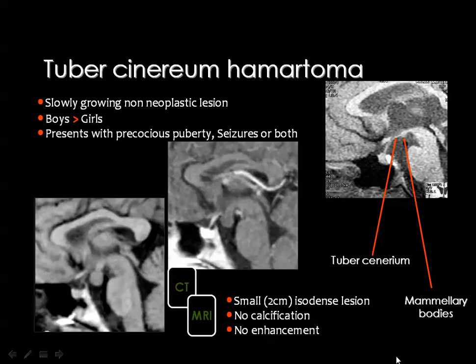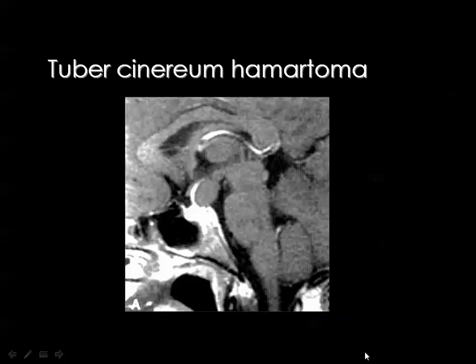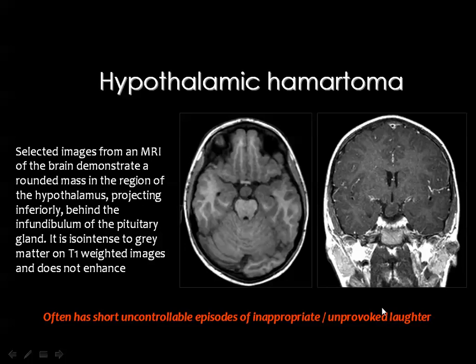may be present. This lesion is typically non-enhancing, and you see a lesion in the region of the tuber cinereum between the infundibular stalk and the mammillary bodies. After injection of contrast, this lesion does not enhance, and it does not contain calcium. This is diagnostic, and it may be considered a spot diagnosis whenever you see a suprasellar lesion related to the tuber cinereum. This is the mammillary body, and this is the infundibular stalk, and the lesion is not enhancing, then the diagnosis is almost certain.